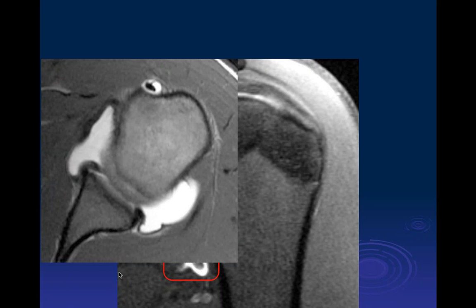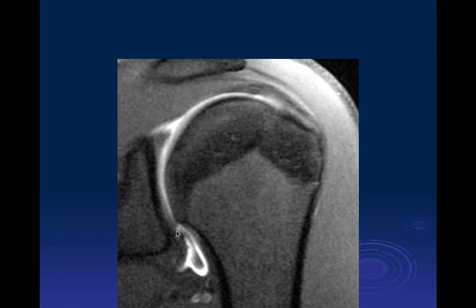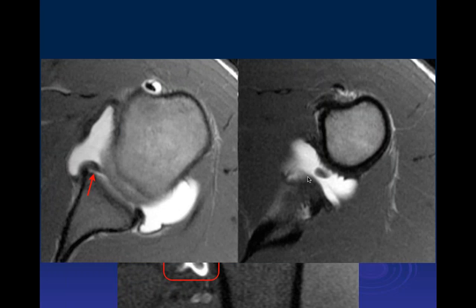So here's the axial image. What do you see on the axial image or the arthrogram? So we see a small sliver of signal intensity extending along deep to the anterior labrum right there. So it looks like there's a tear. So this is a tear of the labrum, and what we see here is actually a flap tear, and the flap is displaced into the inferior recess, but it's still connected inferiorly here. But this is all a flap tear of the labrum, and here it is in the axial plane, that labral flap.